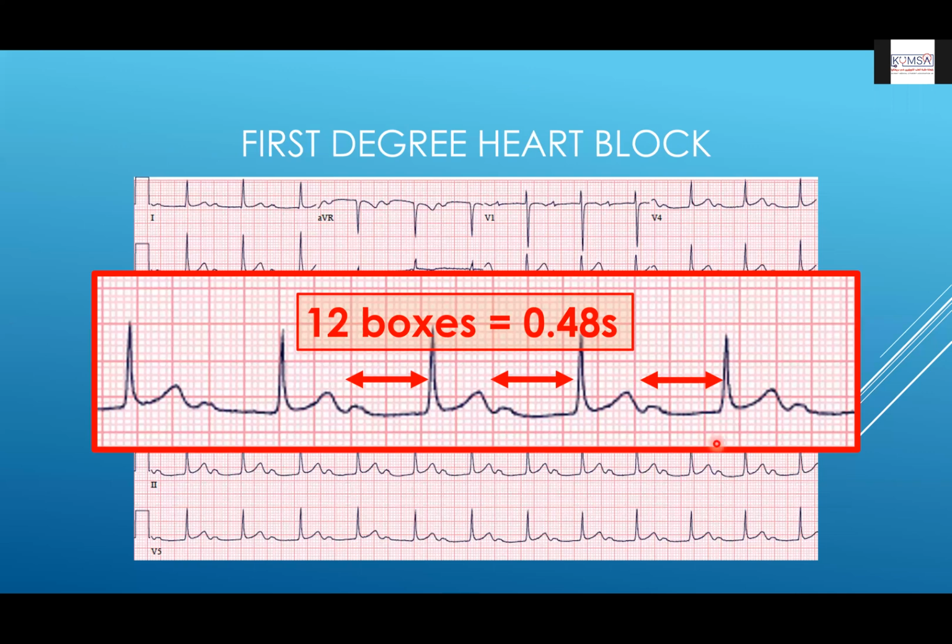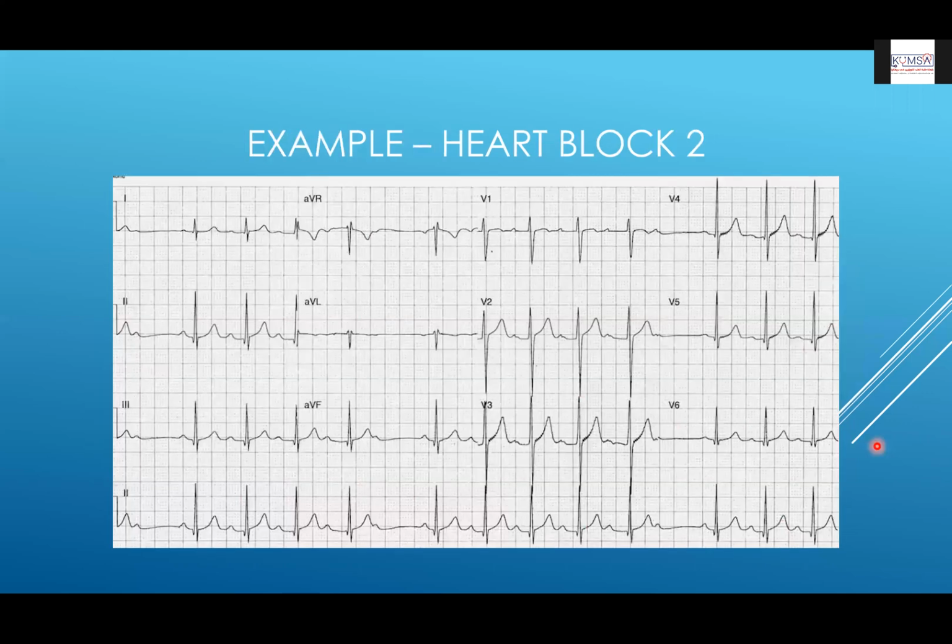Now, I'm going to move on. I'm going to give you another type of heart block, and we'll interpret this together.